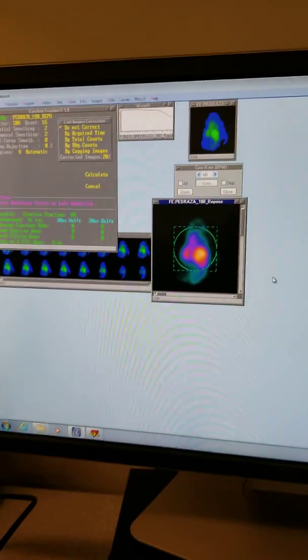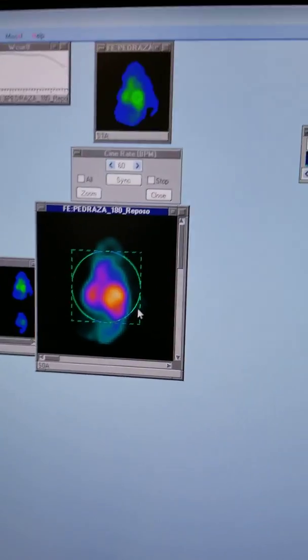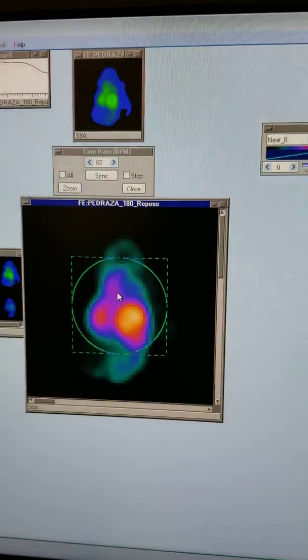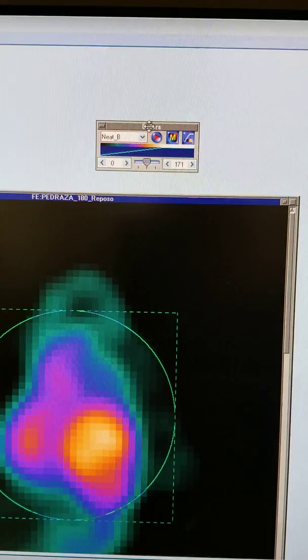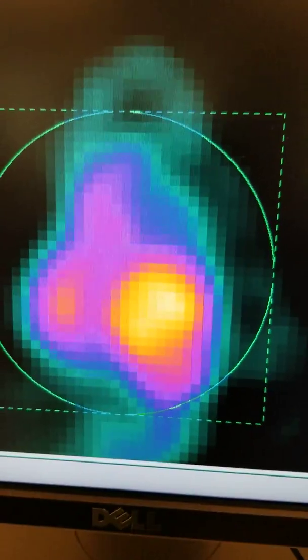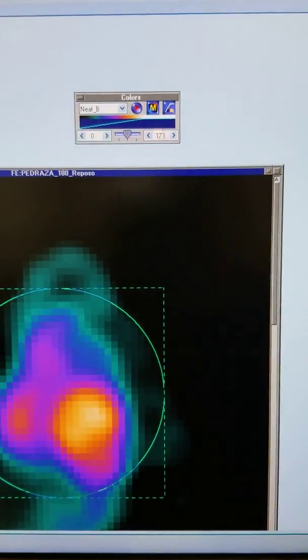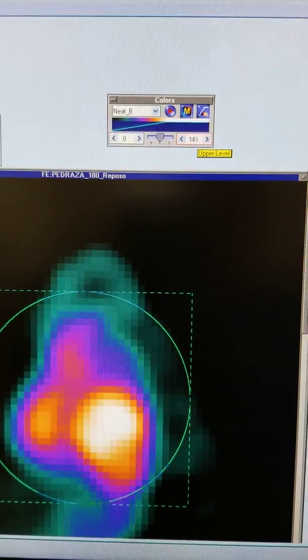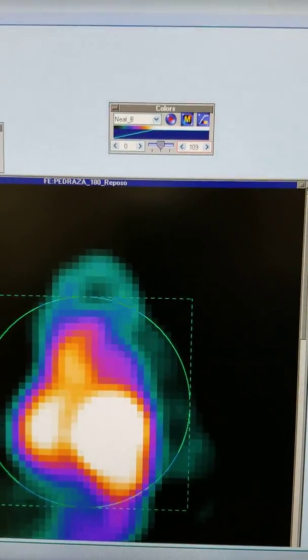Okay? And that's going to set us up for the gradient, which is the pre-made ellipse here. Again, first thing we want to do is resize. Okay, and then we want to adjust the brightness. It says that it didn't change the brightness, but y'all, this is not as hot as it was a second ago. It's just not. It's a lie. Okay, so readjust your brightness again. Okay, that's at about 109. Super bright, but I can still see the septa there.